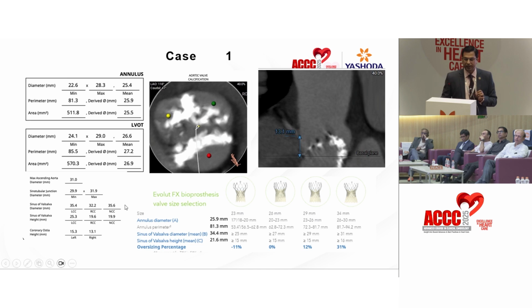And according to the company's IFU, in this case, what valve to choose? In a severely calcified anatomy, going with a balloon-expandable becomes a little challenging because you don't have control over how it expands. The advantage with a self-expanding platform is that it can conform with the contour. In a bicuspid aortic valve, instead of being circular, the supra-annular contour is more of an ellipse.